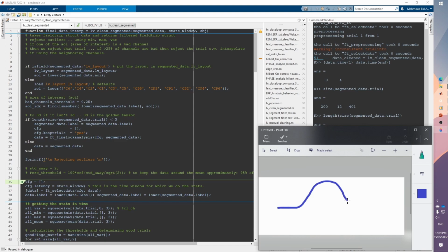We create a distribution for our data, and our data more or less looks like a bell curve, a Gaussian distribution like that, so that we can define our mean very clearly, and then we can look at a standard deviation, 1 standard deviation away from the mean. We can look even 2 standard deviations away from the mean, and we can define anything that will fall in this part as an outlier.